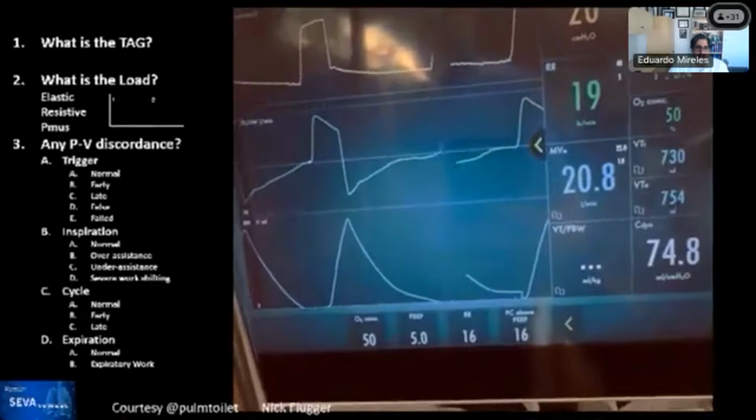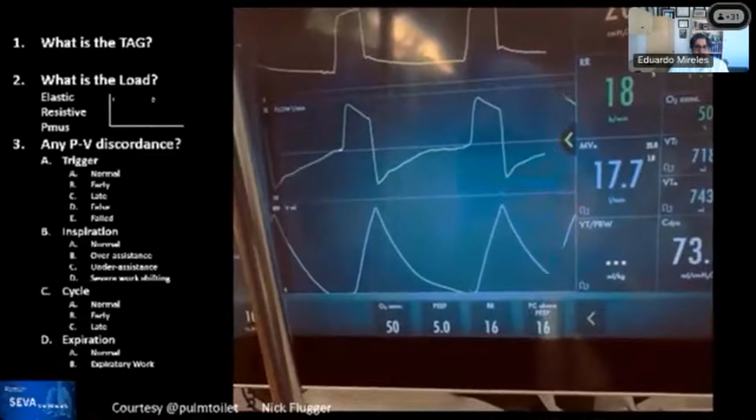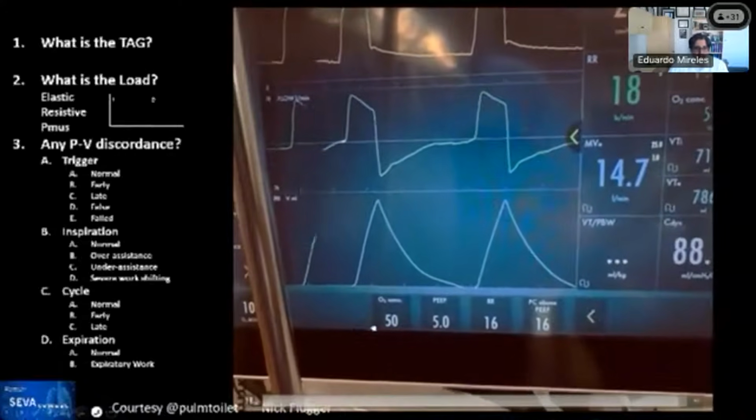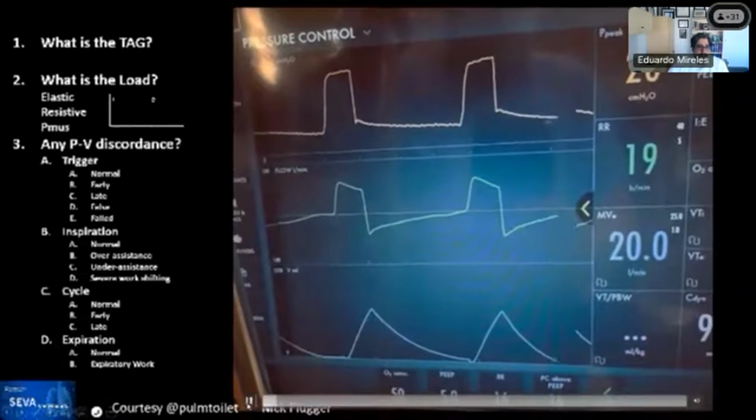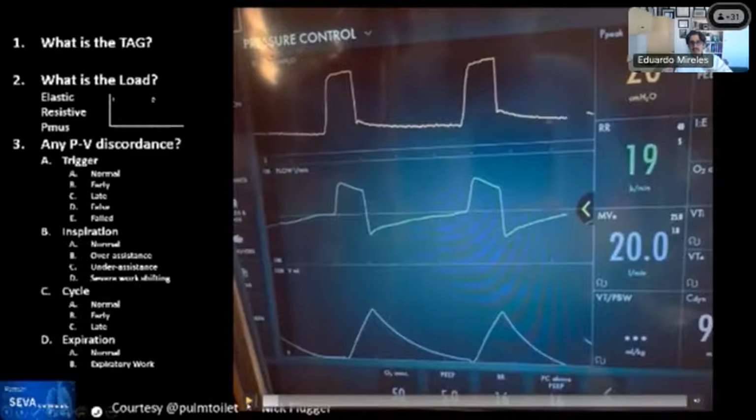All right. And that's the end of the sequence, I believe. Yes. There you go. I'm going to pause it. So, ta-da.